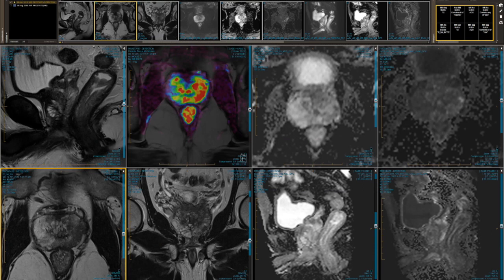We may be able to have a worry that it would be there based on other patient factors, Gleason grade, volume of tumor. For us, the most important thing is we're using where the tumor is for planning. In a way, it doesn't really matter if there's a bit of extraprostatic extension that we can't see, as long as we've mapped where the tumor is, both for the surgeons and for the focal treatments, because they know where the capsule is, if there is any breach or any microscopic tumor, that is where it will be.